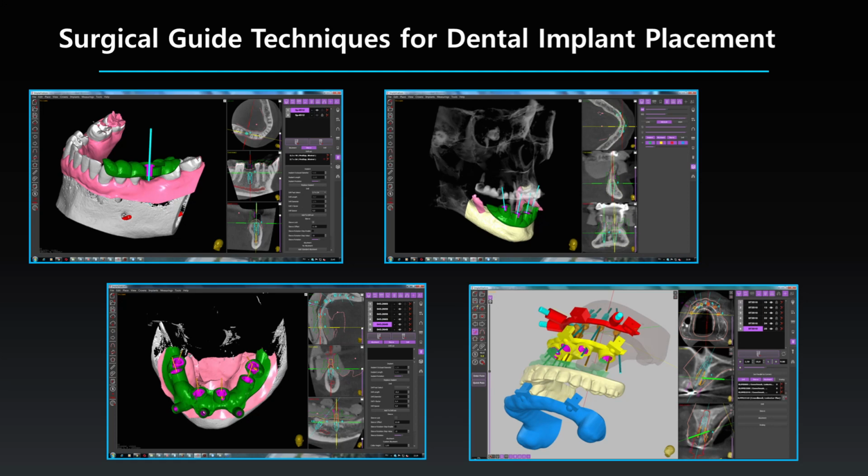Stabilized by the wide-ranging remaining teeth, the tooth-supported surgical guides are commonly applied to a tooth gap with limited missing teeth compared to the mucosa-supported and bone-supported surgical guides. This rigid support from the teeth provides a sound basis for the correct intraoral seating of the guide, which is of prime importance to attain accuracy.